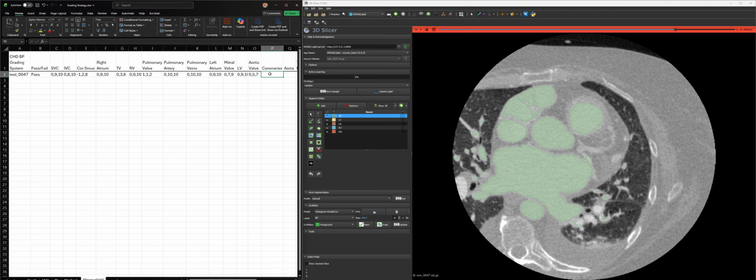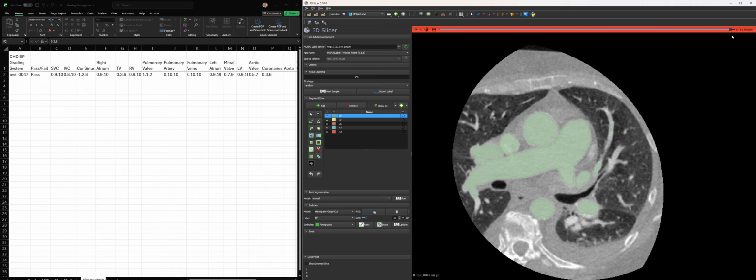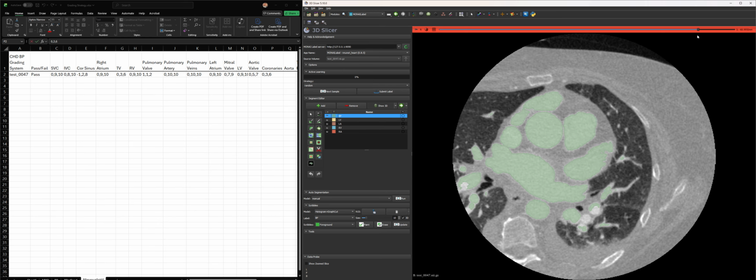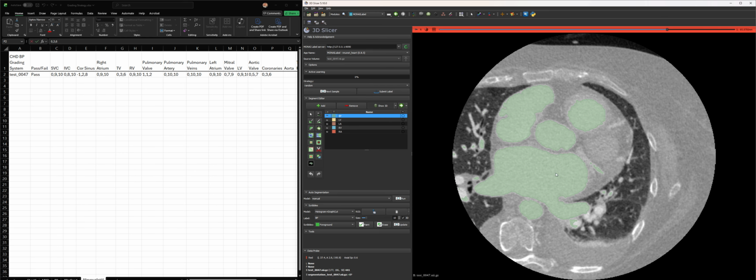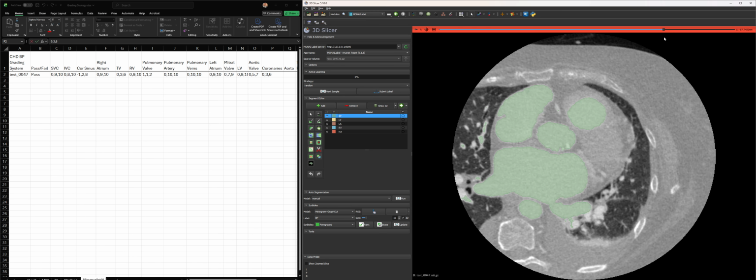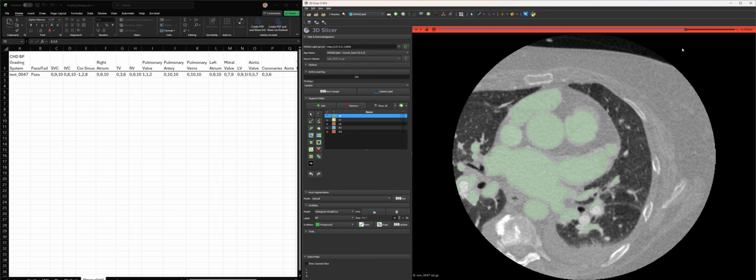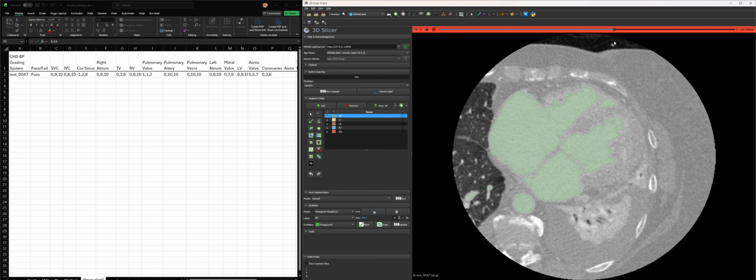I can see where the origins are, so it's sort of a barely pass. 0, 3, 6. Okay, now we are to aorta. I have ascending and descending separated, but I still sort of score it as 1. Ascending doesn't appear to bleed anywhere into any other structures. The descending looks good.